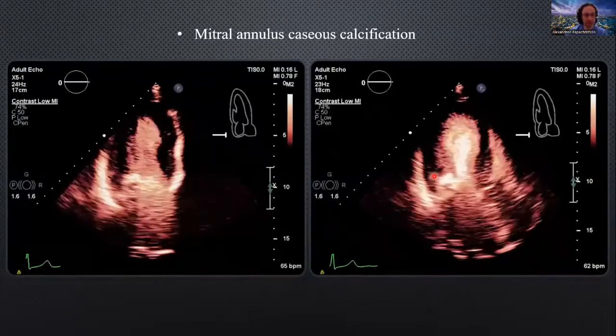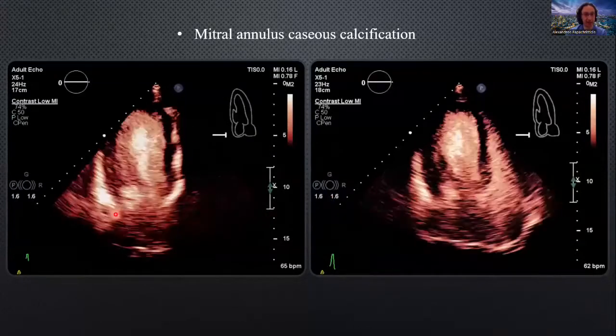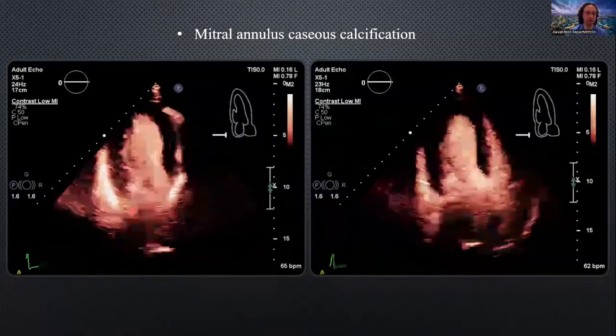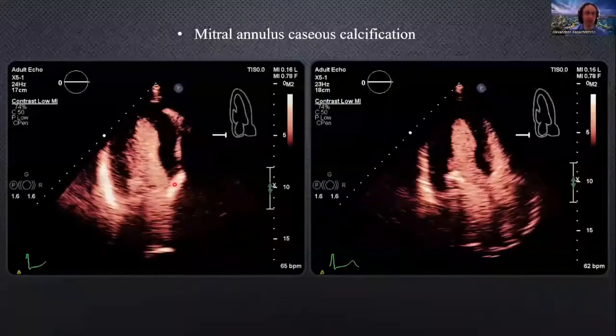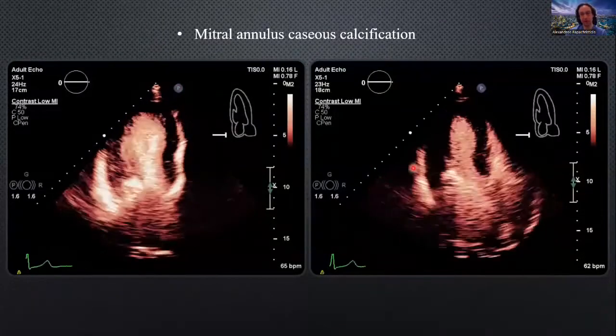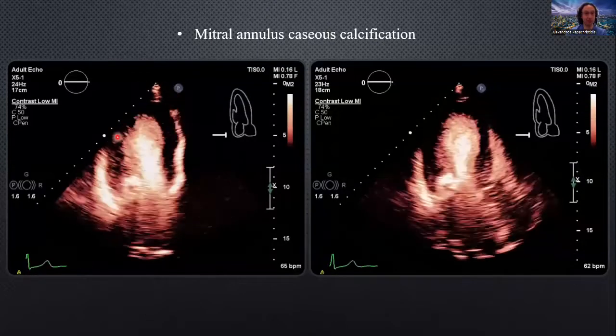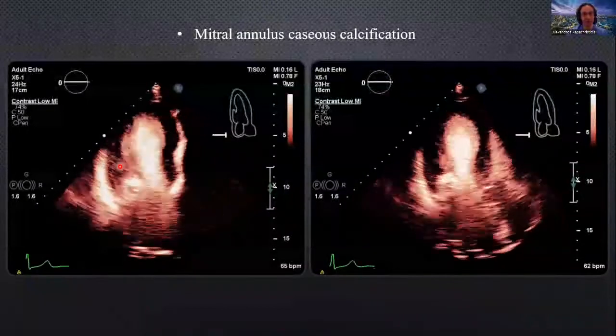And if you go back to this patient with the calcification, you can see here how the calcification is enhanced, but not only that, also the pericardium, which has a nonlinear response, is extremely bright here compared to the myocardium, which is completely suppressed with power modulation echocardiography.